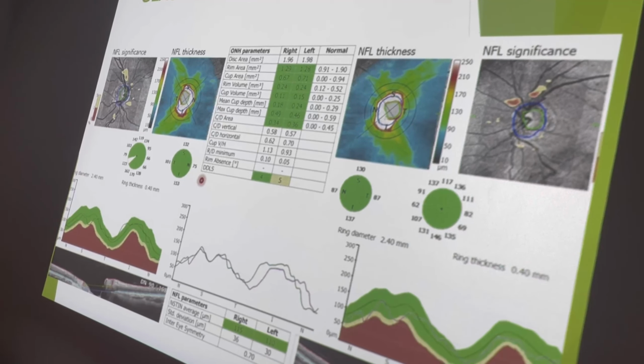And also another thing, in high myopic patients, the RNFL fibers will be shifted temporally. So in the graph plot, we can see a false increase in the temporal quadrant and thinning of the superior and inferior quadrants. So in such patients, it will be very difficult to diagnose glaucoma. In such patients, macular GCC is considered good, as it is less influenced by these factors.